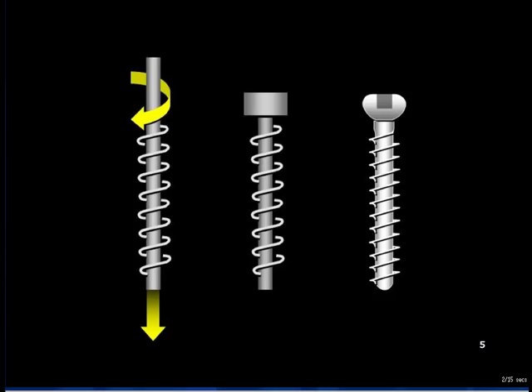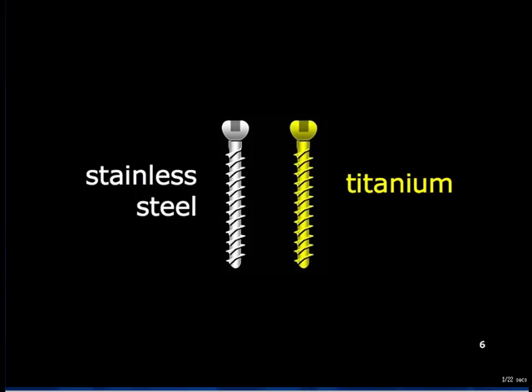With the exception of some corkscrews, a generic screw has a solid central core, about which is wrapped a helical surface. In the surgical context, most screws have a screw head, the function of which will be described later. One of the basic attributes of surgical screws is the material of which they are made. Most are metal, either stainless steel or titanium, being inert, or virtually inert, in the body tissues. Of course, biodegradable screws are made of a variety of materials that are not inert in the body tissues, as they are designed to be absorbed slowly.